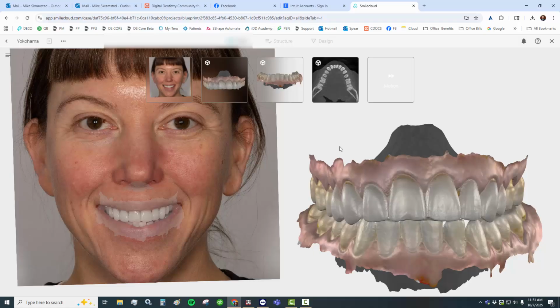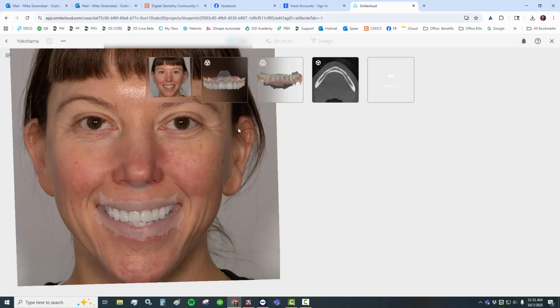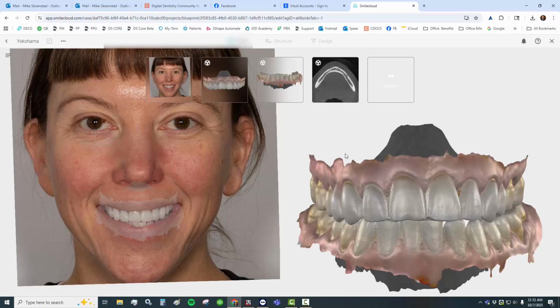Okay, so now this is going to take a little bit of time, just a minute or two, just to go ahead and align everything automatically. You can see it kind of working in the background, and I'll show you when it's done what this looks like.